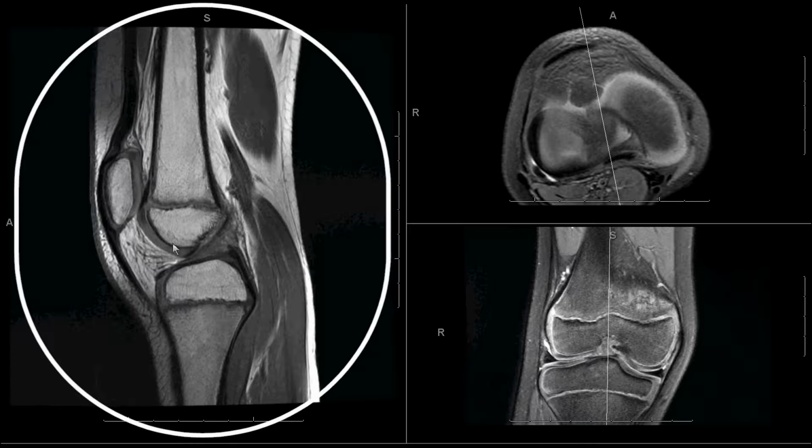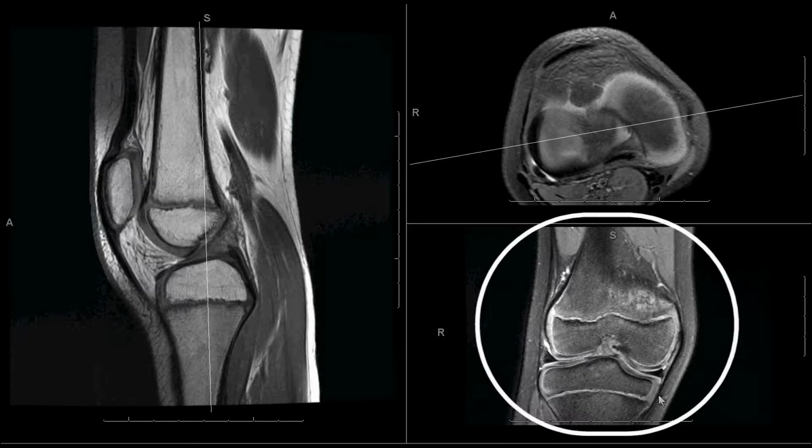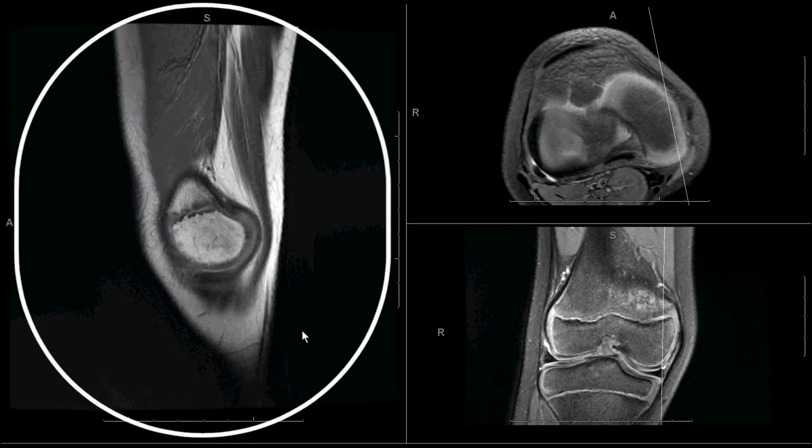So here we are in the midline. If we look at our corresponding coronal fat suppressed proton density image, you can see that we're in the mid aspect of the knee. Here is the axial, which shows you corresponding pictures of portions of the menisci, and then here the sagittal proton density without fat suppression, as you see with the bright fat noted, and then the skin. So here, let's just move right out into the medial meniscus.